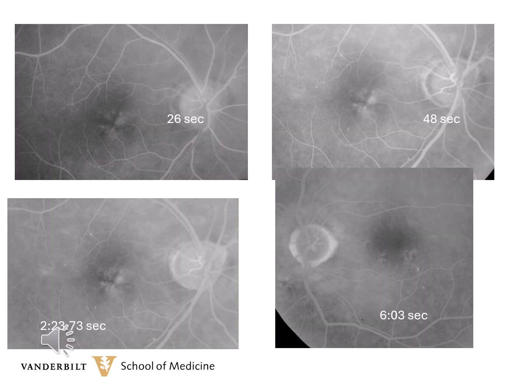Here is his fluorescein angiogram. The left eye on the bottom right just shows some non-specific areas of hyperfluorescence secondary to some RPE atrophy. Pay attention though to the right eye, and this is a fairly typical fluorescein angiographic pattern. There are radiating dark hypofluorescent lines interspersed with radiating hyperfluorescent areas.